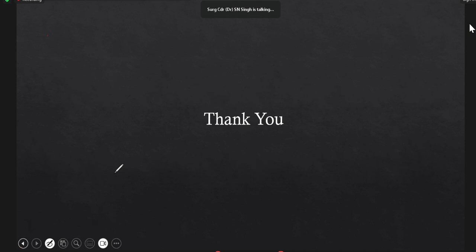That's it. Perfect. Bethlehem is asking, is the collapse sign also applicable for neonatal X-rays? Yes, it is applicable for any X-ray. That is what I said. In a foreign body, like in a child coming with breathlessness and a collapse of whichever segment, the first thing is to rule out a foreign body. And I had shown one slide whereby, in an ICU setting, mucus plugs; if it is bronchial asthma, mucus plug; and in an ICU setting, the other thing is the endotracheal tube and all that stuff. So it happens in all ages. The age-wise distribution of the causes of collapse was given in that slide.